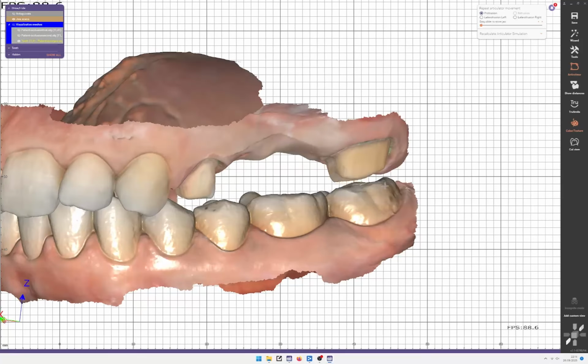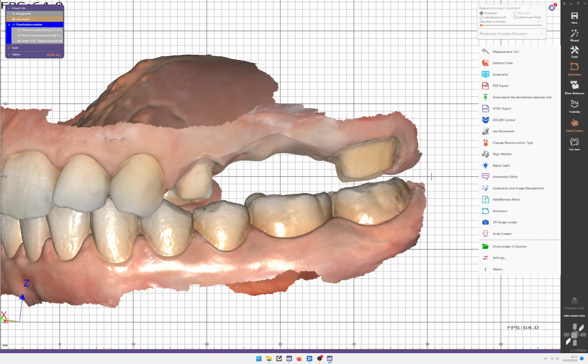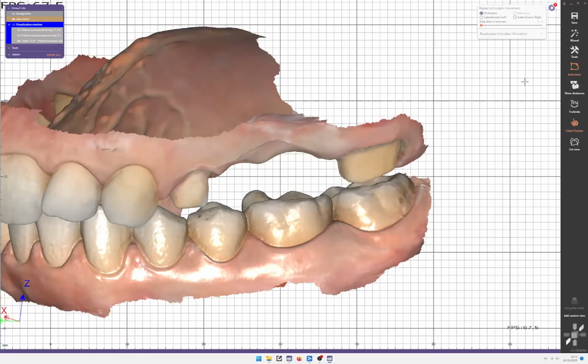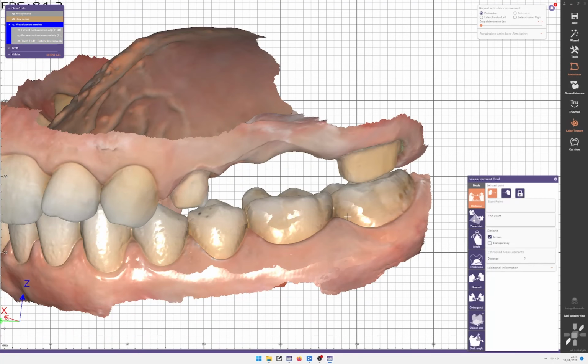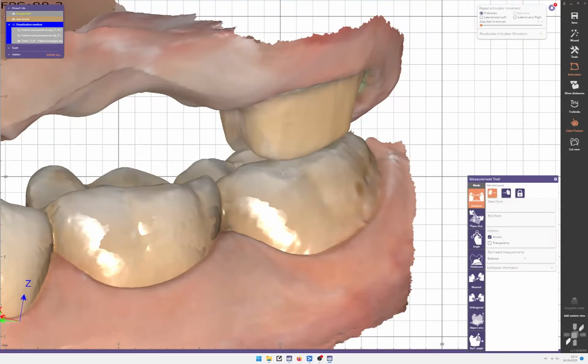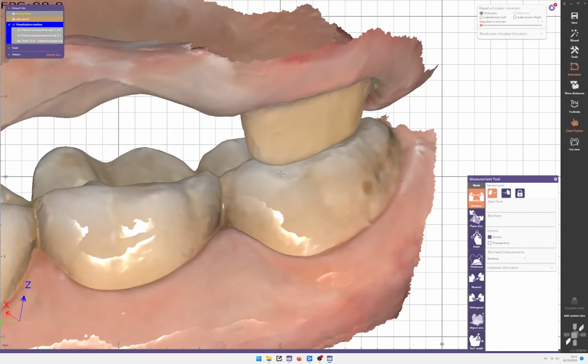The deviation here gets amplified because we had deviations both in the upper and the lower jaw. So before we measured here, I think we measured here like 300, and up here 200. Now we're gonna measure the sum of these both, because we aligned first the upper and then the lower, and the lower compensated for both. So nearest, let's go this and these.